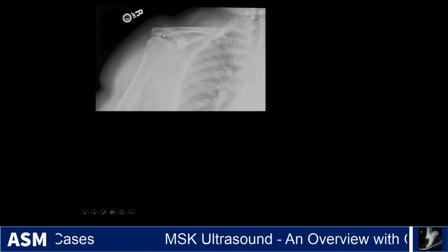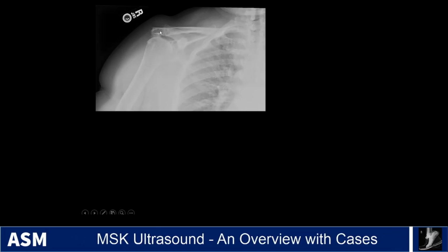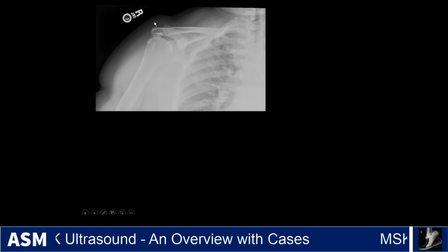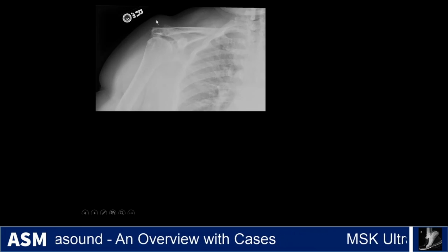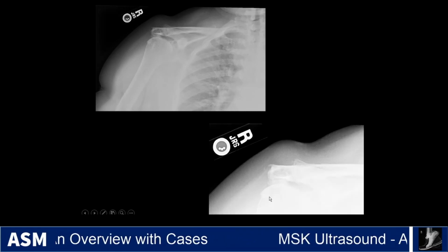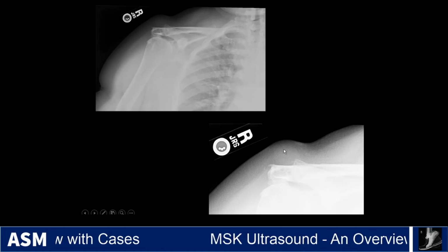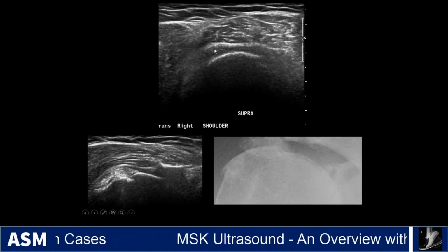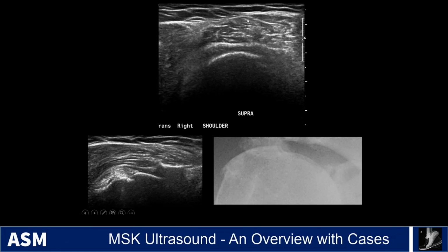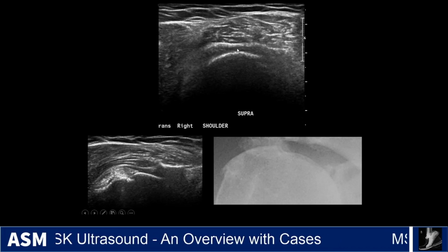In this case, we see a high-riding humeral head. We see some calcification where the rotator cuff should be, and it's not super easy to see, but if you look carefully at the soft tissues, there's fullness right here, and the patient actually presented with a soft tissue mass. And so I windowed this a little bit, and you can see the soft tissue sort of nodule up here. And so here is the rotator cuff. Here's the humeral head here, the deltoid sinking down and almost coming down with the bursa to the humerus here.